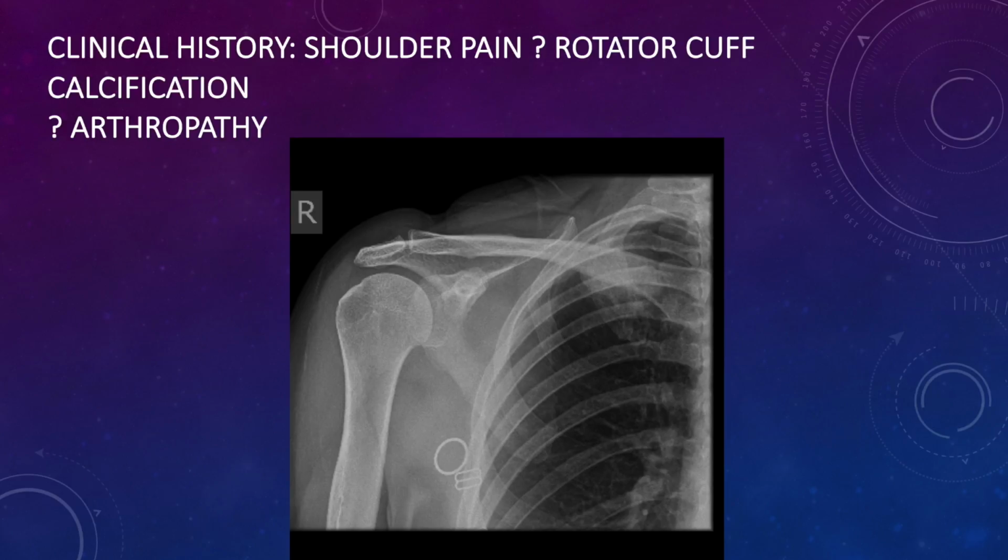So what do we think? Have we got any rotator cuff calcification? And you'll start reviewing the image. You'll start thinking about your subacromial space. Is there any rotator cuff calcification? What's my AC joint doing? Okay, glenohumeral joint. Are we making any diagnoses yet? Anything jumping out? Fairly normal, standard film, happy.